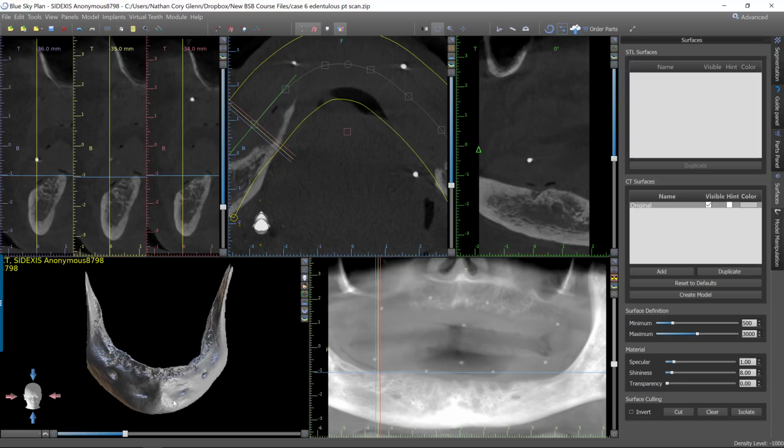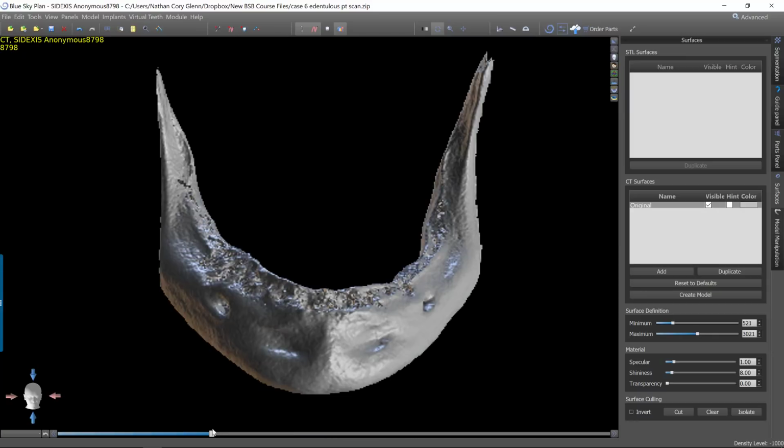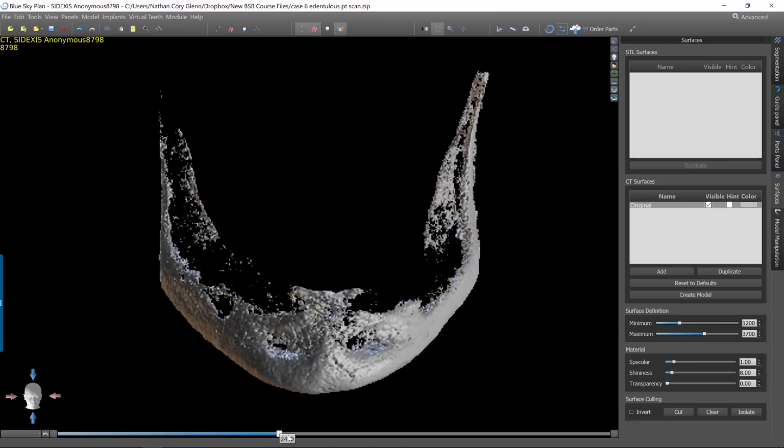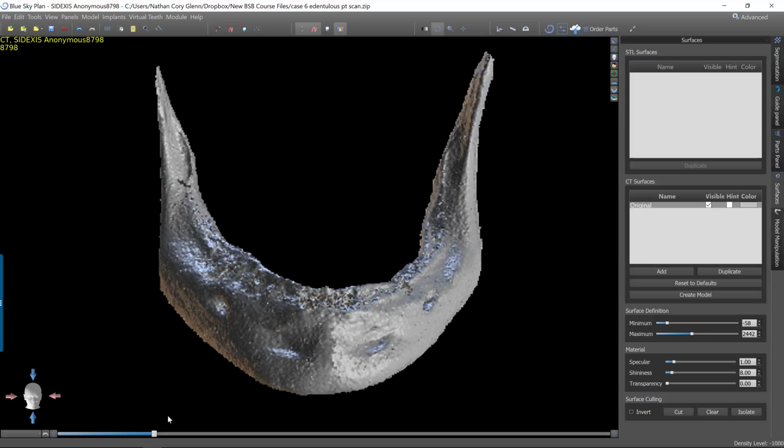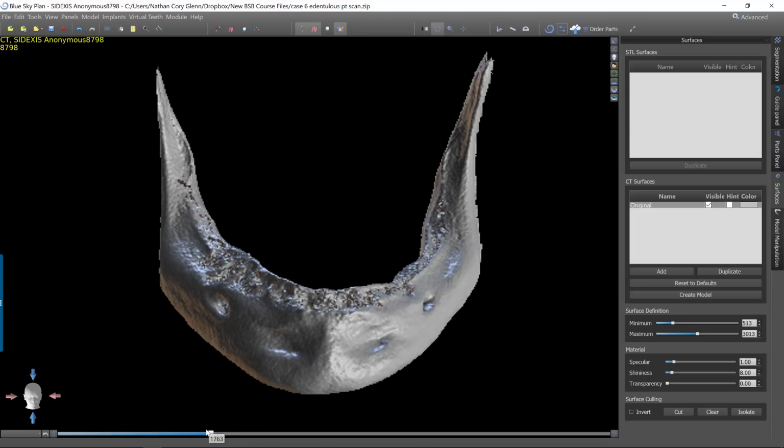And if you look at the rendering of this, I'm going to look at where we are right this moment. So about 1770 is what the 3D rendering is set at. If I was to drag this up, you can see that it gets even more porous. If I go more to the right, it looks like it's physically growing a little bit, and then it starts to get grainy before it finally just kind of washes out. So let's go back to where the software originally had it. However this slider appears, or the density appears in the slider menu, that's what it's going to do.